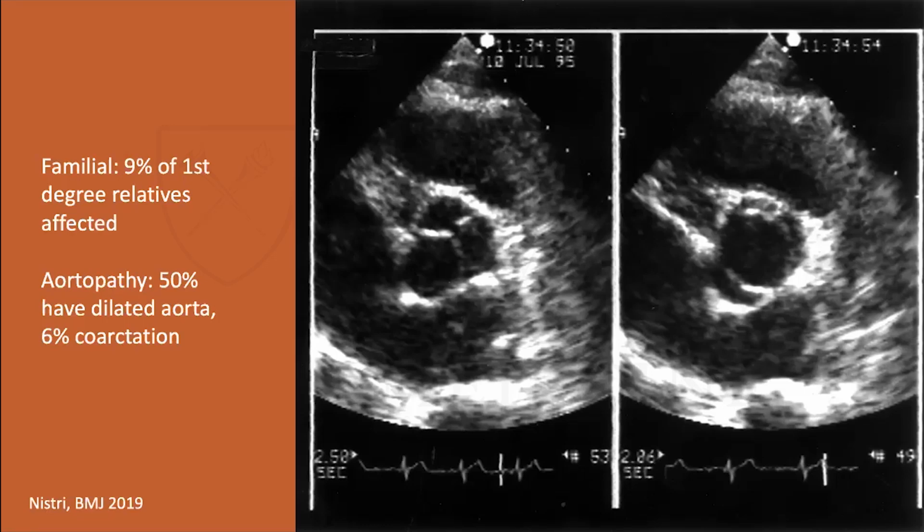And of course, if you do confirm a bicuspid aortic valve, make sure that you measure the size of the aorta, because 50% of the time they can have dilation of the aortic root and ascending aorta. The other thing to keep in mind is that 6% of the time they can have a coarct. So you'll have to take a good look at the suprasternal notch views and get some pulse wave Dopplers. Now, this is, I think, a board question: patients who have a coarct, 50% of them will have a bicuspid valve, but patients who have a bicuspid valve, only 6% of the time will they have a coarct.